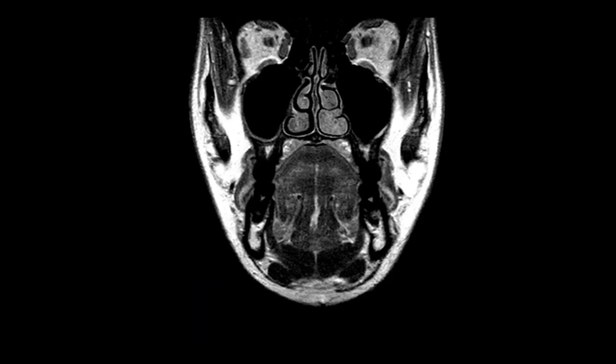So now let's look at these muscles on this coronal MRI. At the very top, we can see the superior longitudinal muscle. Centrally are the two prominent genioglossus muscles. Laterally are the hyoglossus muscles, and below the genioglossus is the geniohyoid muscle.